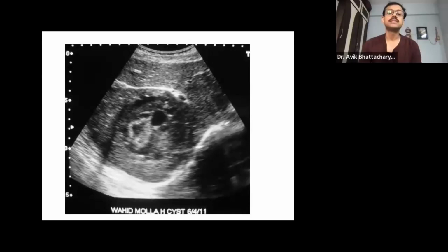All right. So this is a CE4 variety of hepatic hydatid cyst where you could see one daughter cyst inside, a black or anechoic cystic lesion within a heterogeneous mass-like structure. So when a hepatic hydatid cyst becomes an inactive or dying cyst, it becomes an inhomogeneous or heterogeneous soft tissue mass-like lesion that we call the CE4 stage of hepatic hydatid disease. And this is that.